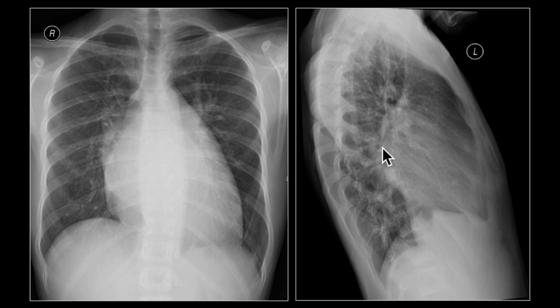Now, high up below the hilar structures, the hilar structure is here in the central area, you should not see this bulge. This is part of the posterior cardiac border that's formed by the dilated left atrium. So this bulge posteriorly is the dilated left atrium, and it confirms what you saw on the frontal radiograph as enlargement of the left atrium.